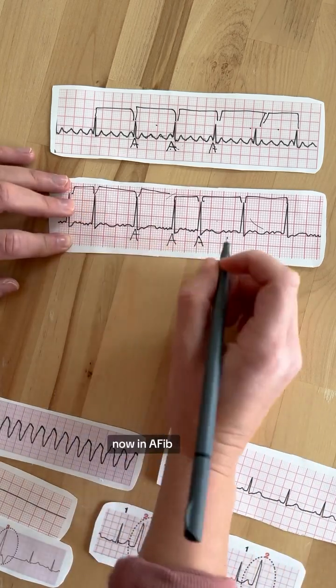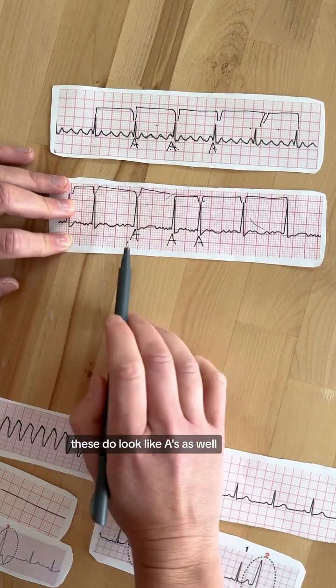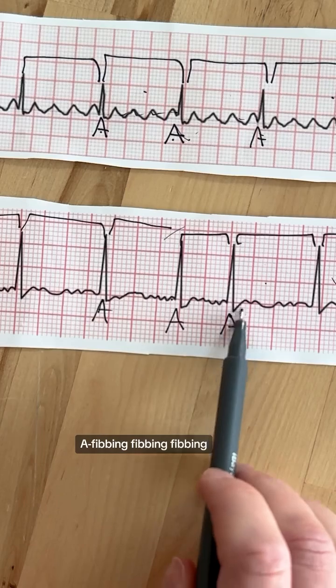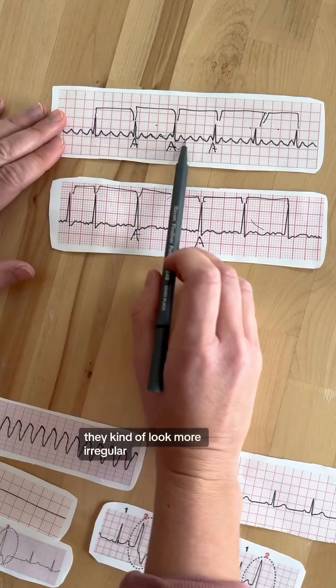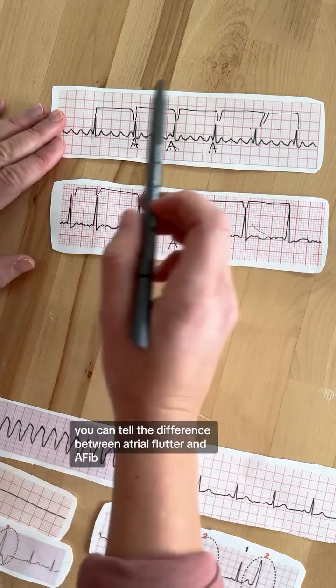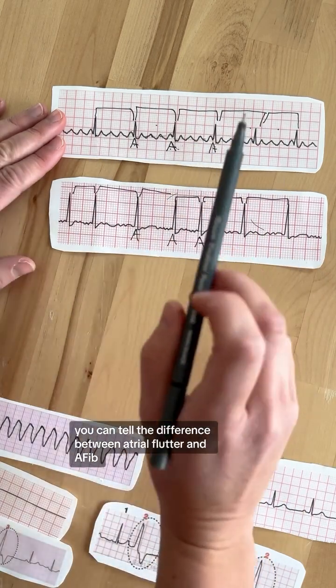Now, in AFib, these do look like A's as well, but we have A, fibbing, fibbing, fibbing, A, fibbing, fibbing, fibbing. They kind of look more irregular versus our nice little fluttering here in A flutter. So now hopefully you can tell the difference between atrial flutter and AFib.